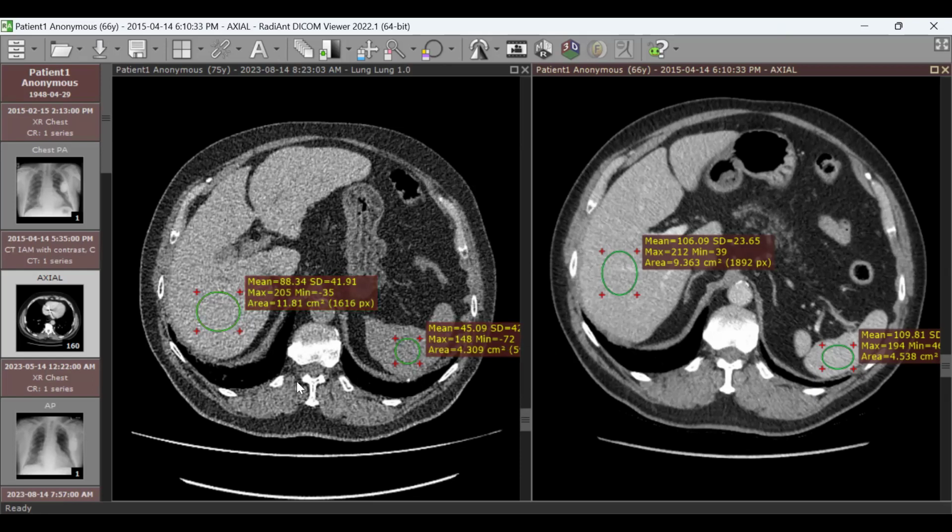What's the upper limit of the density of the liver? After that, we can see hyperdense liver. Normally it's within the range of 50 to 70, I think, and no more than 75 as the upper normal. If it is more than 75, we can be sure. What are the causes for hyperdense liver in general?